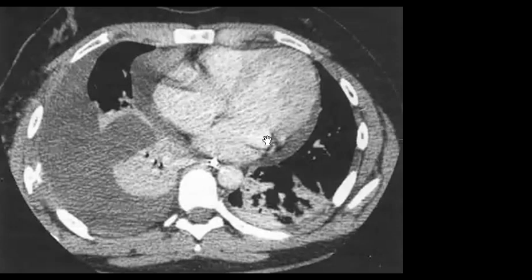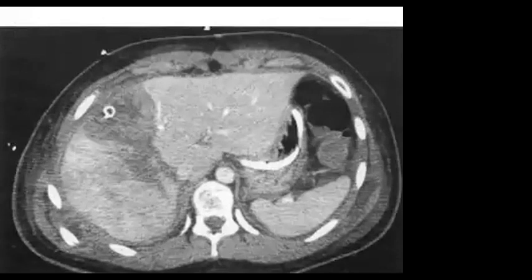Maybe you can start with, there is pleural effusion, pericardial effusion, and bibasal lung atelectasis, and exactly, rib fracture, Huda. Thank you. So there is rib fracture. Then now maybe you think about trauma. So you will ask in the history if there is any trauma and check if there are any other images.